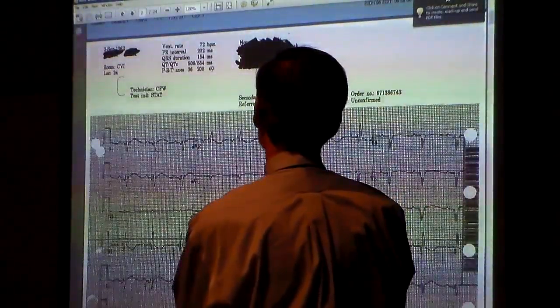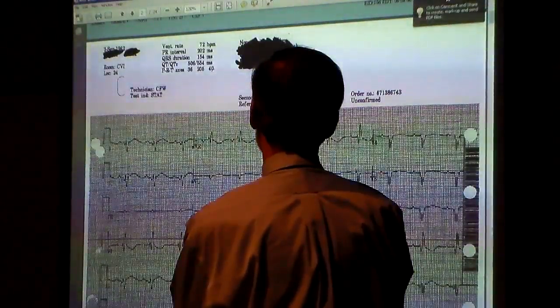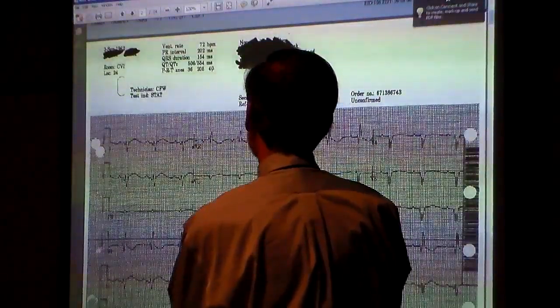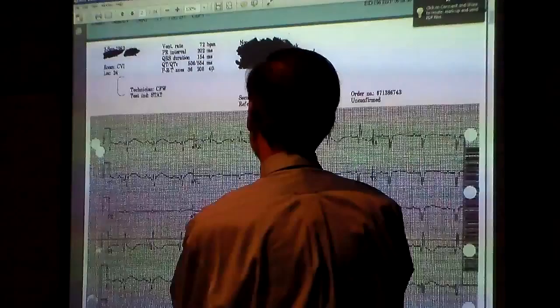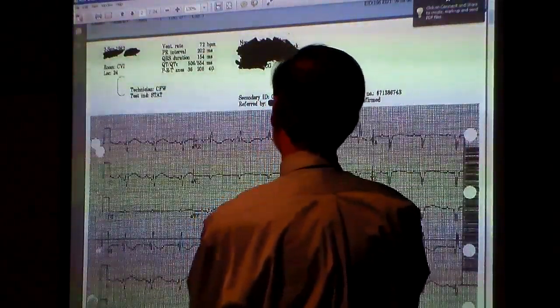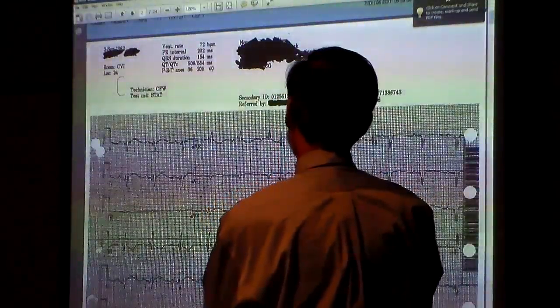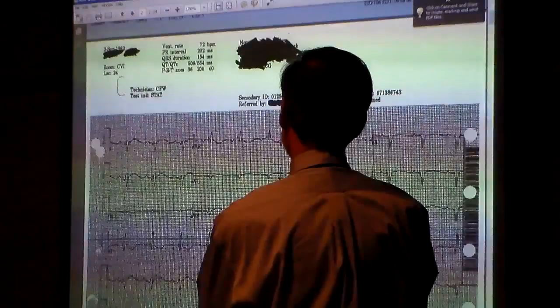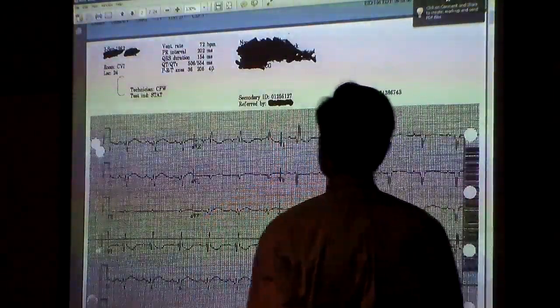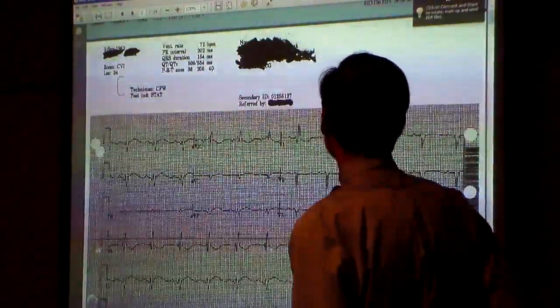The axis is probably part of it. It's going towards the right, but in aVF it's like not really. But I mean, you know it's right, we're just looking. Okay. Right.